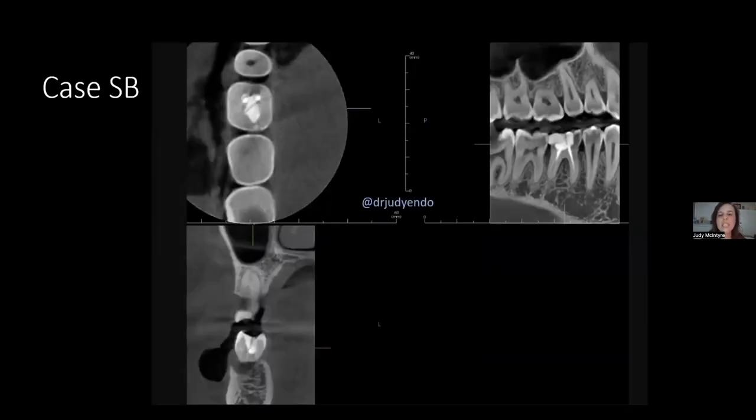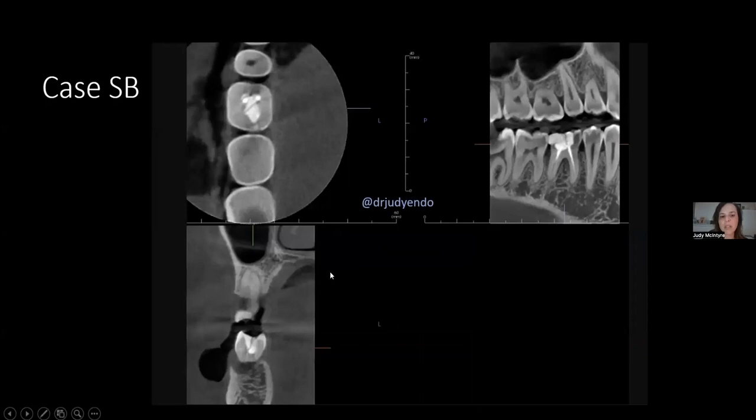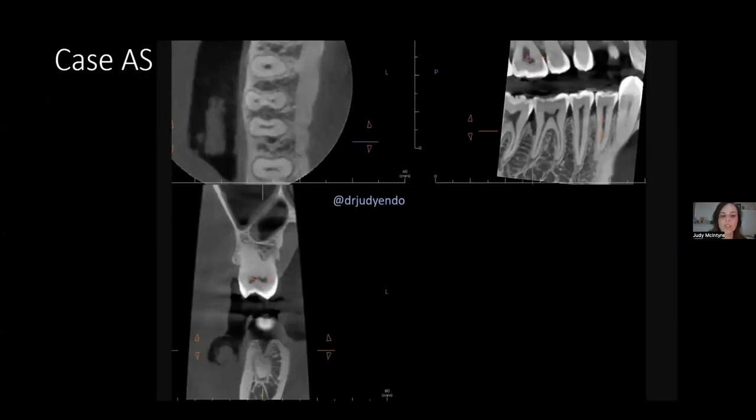All right. This patient came for a consultation, had a previous root canal. And again, I told you, these are rare. You're not going to see cracks so clearly, like lightning bolts with tooth separated segments very clearly. But sometimes you do, and this tooth could not be saved either. And again, mesial bone, a little less of an angular defect there. But again, I'm sharing this because of that separation, and this tooth was scheduled for extraction.